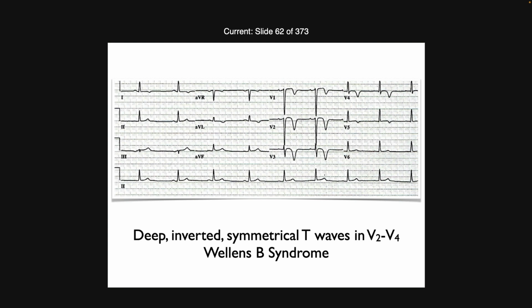These have a very definite look to them. So again, what does it matter? Well, I see some worrisome signs here. I don't see STEMI criteria, but if this patient is exhibiting ACS symptoms, I might get moving a little bit faster, be more likely to do serial 12 leads and so forth.